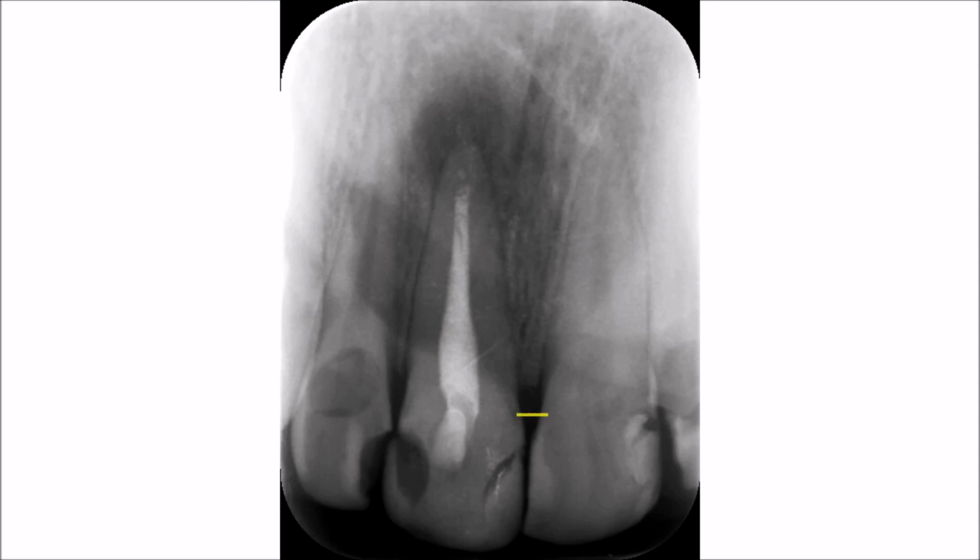Of course, here we cannot determine whatsoever the condition of the gingival tissues clinically, because this would never appear in the radiograph. What the radiograph can show, however not perfectly, but in its best case scenario, is whether there is a loss or more than 2 millimeter distance between CEJ and the alveolar bone crest, and it will also show the type of the lesion that is occurring at the alveolar bone crest, so that we can determine whether this is a chronic or an acute condition.